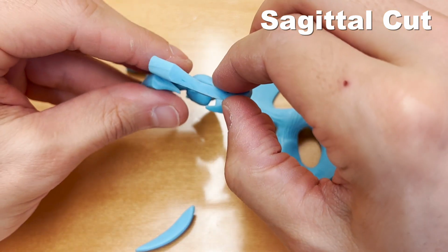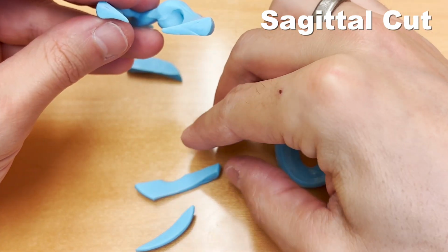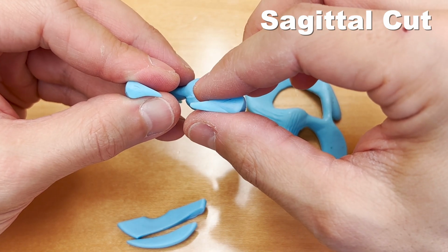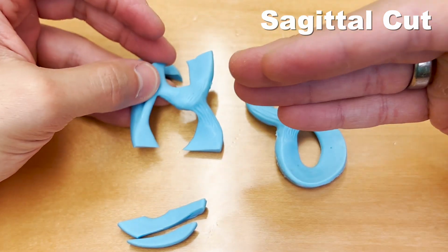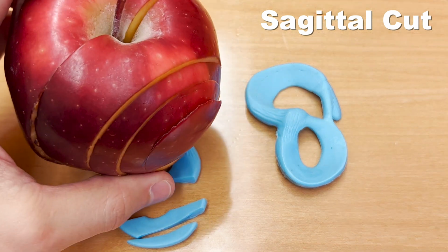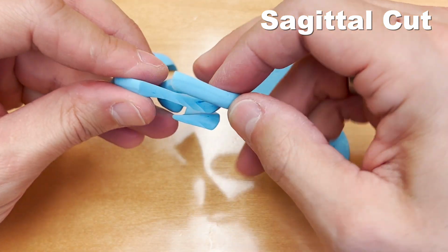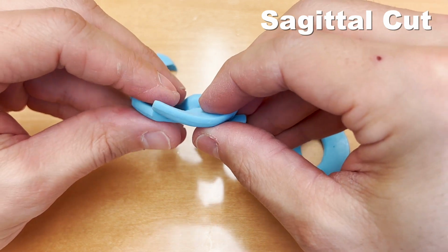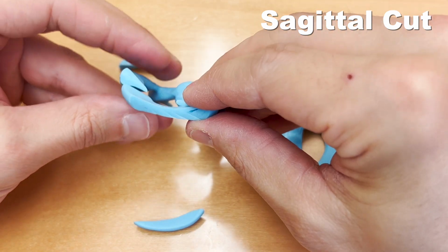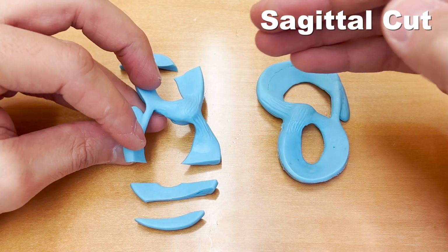It actually goes from looking like almost a single piece here, and then on this next cut, it'll look like two separate objects on the MRI. So it's important to know that by understanding the anatomy of the meniscus, just like we understood the anatomy of our apple here, we can conceptualize the three-dimensional structure of the meniscus in our mind, and as we move through the meniscus, we can understand where we are in the anatomy of the meniscus as we move through all the different images.